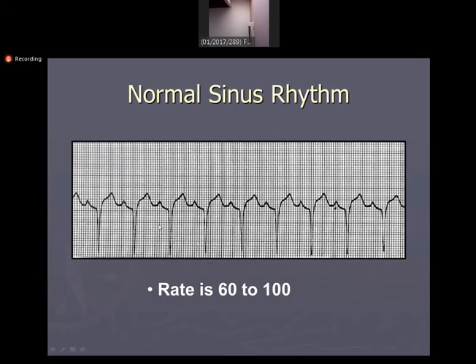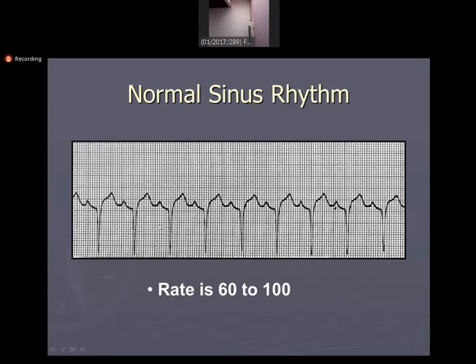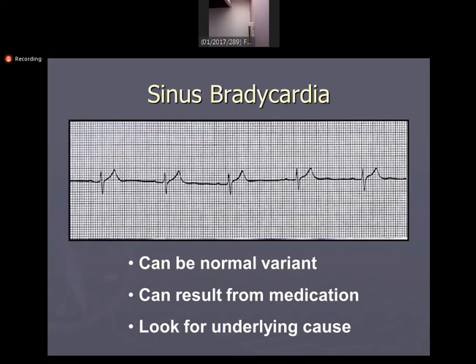You can easily calculate the heart rate, you can identify whether it is sinus rhythm or not, and you can assess the regularity of the heart. I don't want to go into detail because it is not possible to tell you all the things. It is almost impossible. But I just want to tell you how you will start to read an ECG.